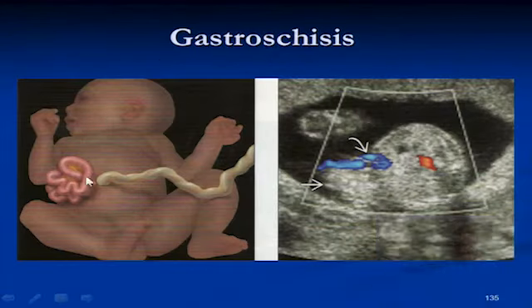This defect here, the diagram shows some bowel to the right side of the umbilical cord insertion, with no covering membrane, and the lesion is para-umbilical, not umbilical, next to the umbilical cord insertion. That's why the cord insertion is normal.